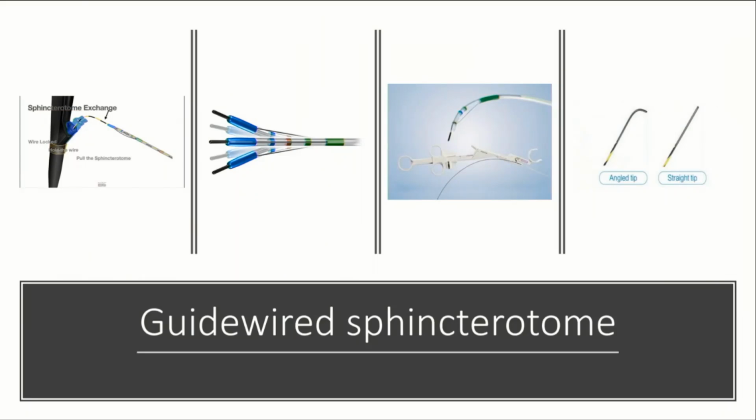Now, how do we cannulate? What are the instruments that we are using? We've gone through various phases. At the beginning, we had single channel simple catheters that do not have the ability to bend. But nowadays, the standard for many, many years, in fact, is to use instruments that we call sphincterotomes, which have the ability, with an external handle, to bend and give us a direction up and down.